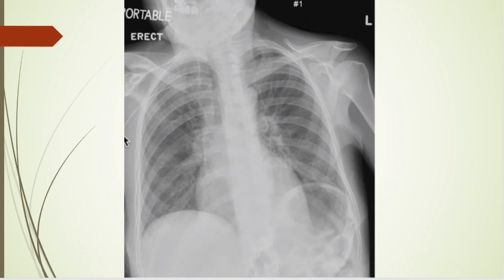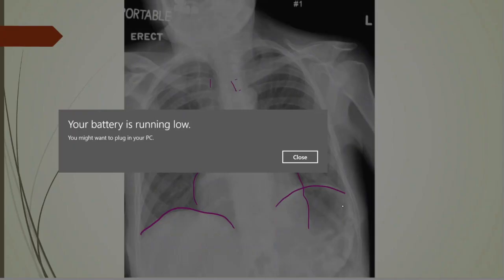And another interesting chest x-ray here. Start off with A, kind of difficult to see the trachea and where it bifurcates. Not a whole lot of help here. All right, well, on to B for bones. C, cardiac silhouette. Although, real quick, you notice this patient's really twisted. This clavicle here is way over midline versus this clavicle, which looks like way out here. Hard to see. In any case, this patient is really twisted, so that's why you have your diaphragms kind of off.